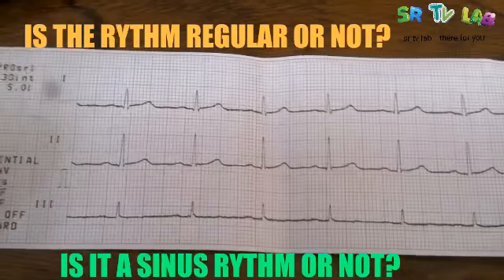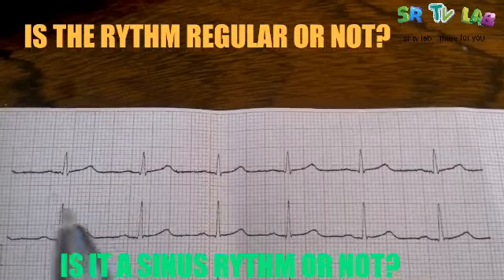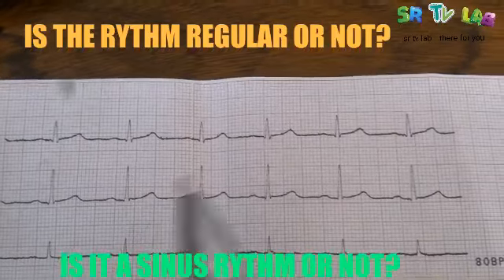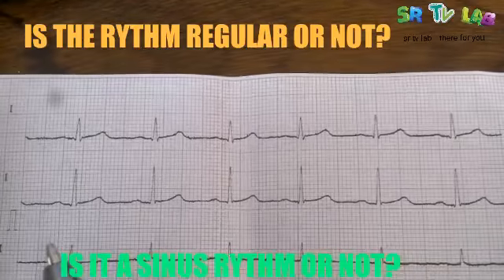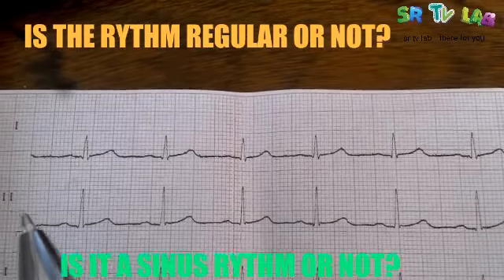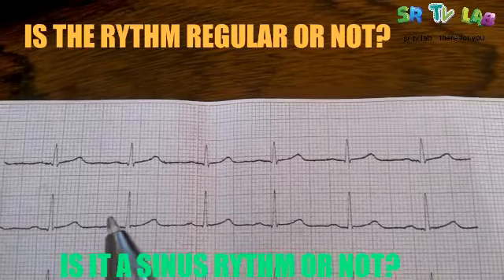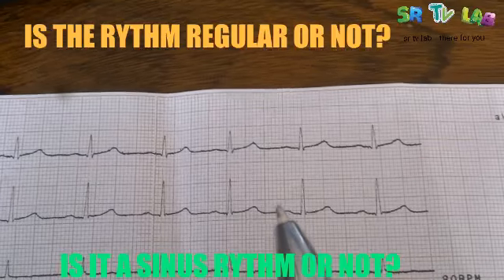Let's start from these bipolar limb leads, lead 1, lead 2, and lead 3. Let's see. Is there any lead where we can see a P wave? Exactly. Here on lead 2, this is a P wave. This is a P wave. This is a P wave. Here is a P wave as well.